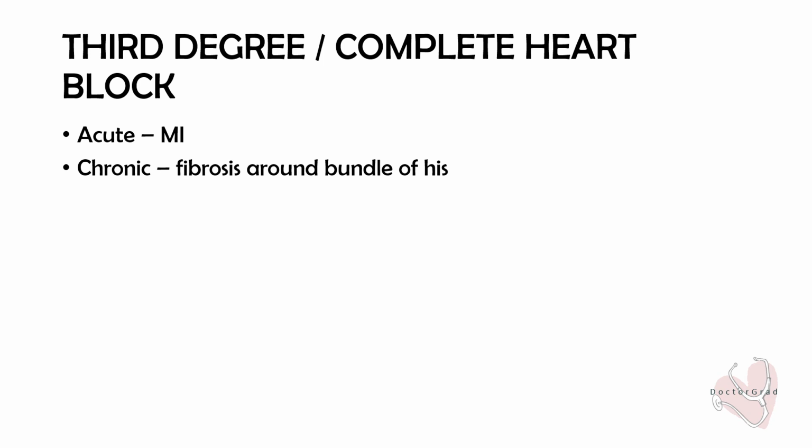So we'll have a haphazard ECG where there is no relation between the P and QRS. Suppose there are ten P waves and two QRS complexes. There will be absolutely no relation between P and QRS.